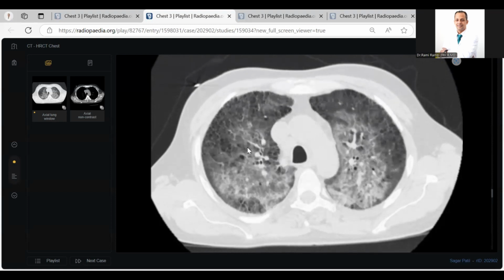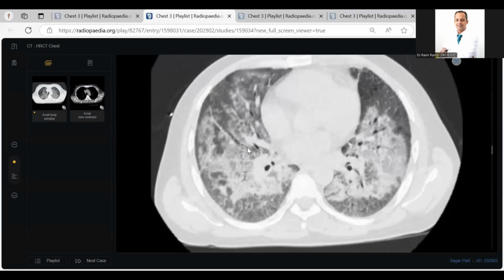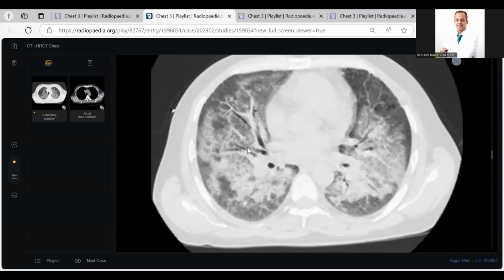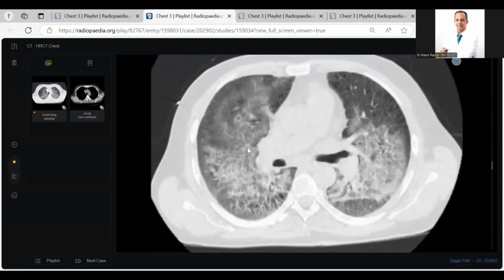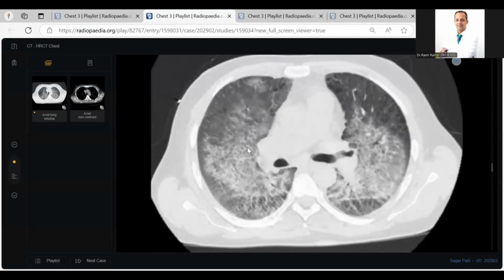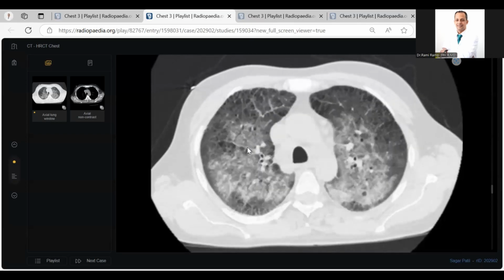I ask one question: if I told you this is not immunocompromised, this is a neurogenic patient or head trauma, you excellently told me this may be neurogenic pulmonary edema. I told you, okay, but this developed 2 weeks later, after corticosteroid therapy, which causes immunosuppression and leads to PCP.